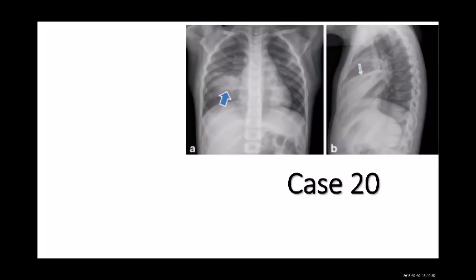In X-ray, we see frontal and lateral views. In the right lung, there is a poor cardiac shadow in the right side. Not a well-defined cardiac shadow in the right side. And if you look at the lateral, it's not within the heart. And it does not look like a mass because it's a wedge shape. You see, it started from the middle as narrow and then widening when it goes out. So it's not a mass, right? It looks like opacity, but it does not look like a mass, right?